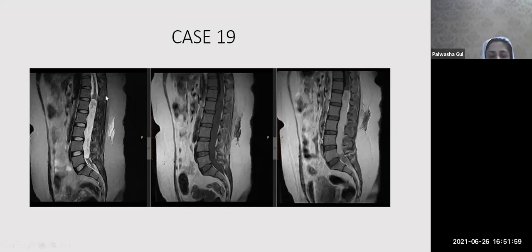And the second thing, ependymoma, which is sitting over here in the conus, okay? This is very notorious for causing hemorrhage. So let's say if you come across a subarachnoid hemorrhage in the brain, and you cannot find a cause for it, the patient has been aggressively investigated. One of the possibilities that should come into your mind is a spinal ependymoma, which is sitting lower down, but being notorious for hemorrhage, can cause subarachnoid hemorrhage, okay?